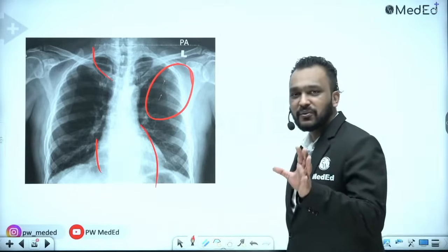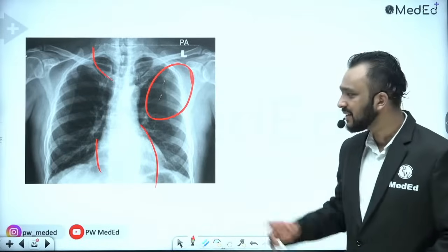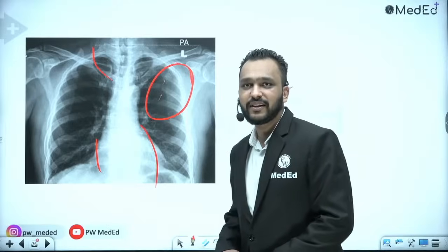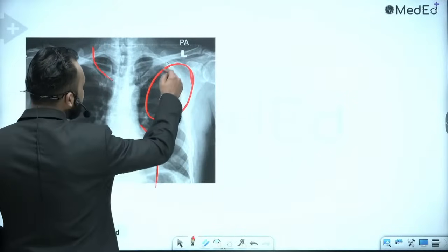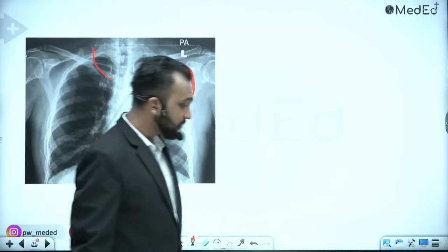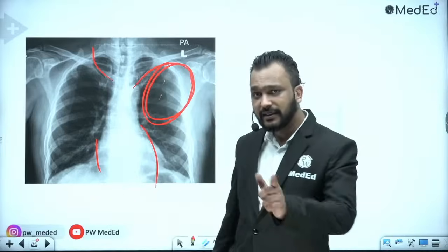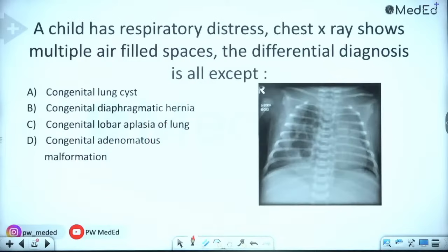So X-rays may look very simple when you are looking at them, but they are not so. Even radiologists can miss these findings. Very good, Sachin. Okay, so there is fracture involving the ribs on the left side. So always look at the bones. That is why I didn't give you the history of trauma in this patient. Then it would have been very simple for you, right?